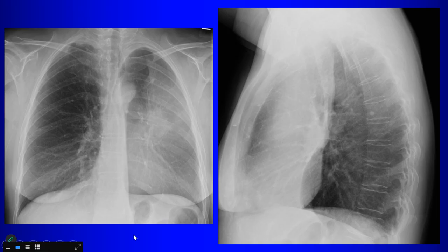There's a lateral view. What's the finding on the lateral view? It seems like it's left upper lobe. What is this? See that?